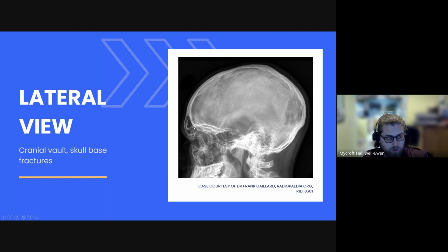It's really quite important, particularly for us. One of the most important things to appreciate is that the nose comes all the way out beyond the screen, and the brain really sits only in the top. All of this space here, which is most of what we would call face, and is really quite far back, is mostly not part of the cranial vault. So it's just good to think about our anatomy. We've got maxilla and upper teeth. We've got a couple of lower teeth in here.